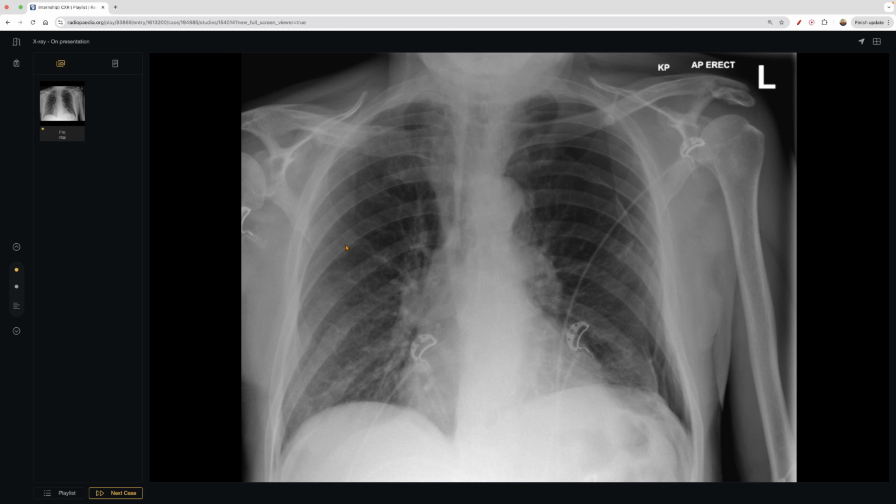So we're moving on from the pleural effusions. Let's put this back up. A known patient with emphysema presented with sudden onset of shortness of breath and pleuritic chest pain on waking. On auscultation, they had reduced air entry to the left. So we look at this and we can see the clavicle here. We notice something. It's a little off, right?